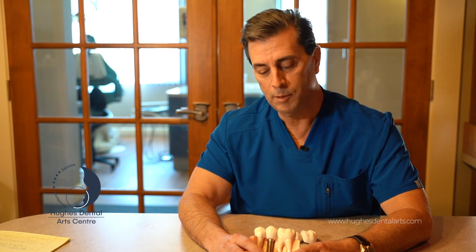We're going to talk more about if we're missing multiple teeth and how dental implants can be used in those situations. But this is the basics, Dental Implant 101, and this will help you understand what fundamentally a dental implant is.